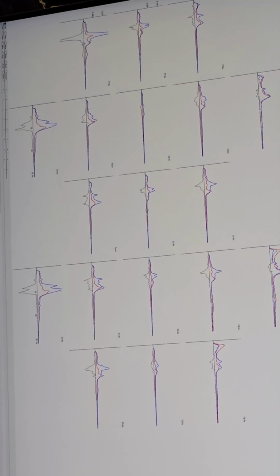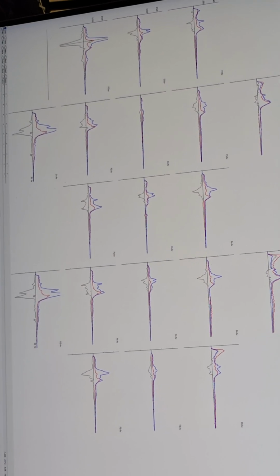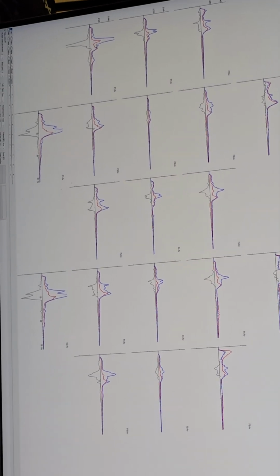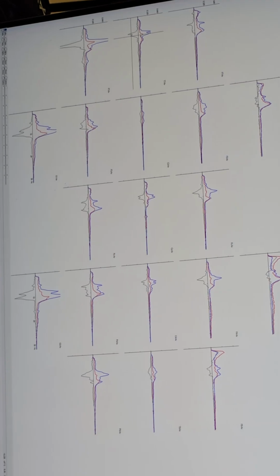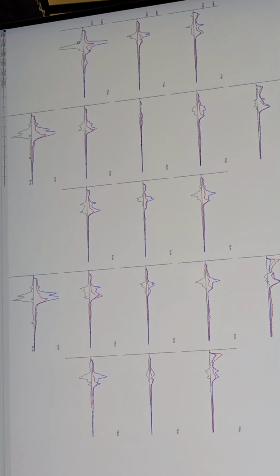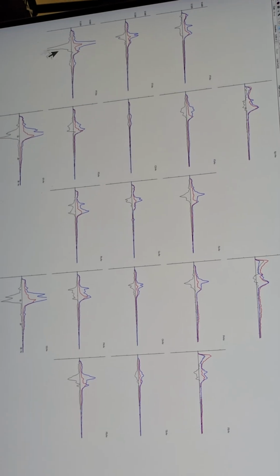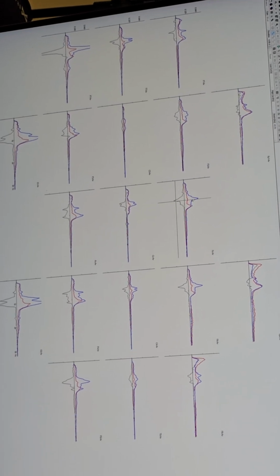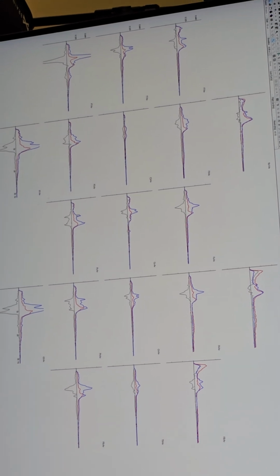What's interesting is there's still a slow feature here. See how over here, on the left temporals, you've still got this 8.3 hertz, but it's much less. That's kind of interesting because the left temporal is still a little slow. The 8.3 hertz has disappeared from the frontals and elsewhere.